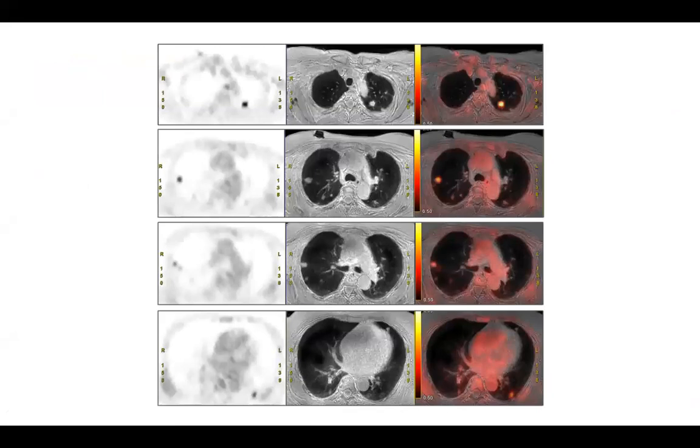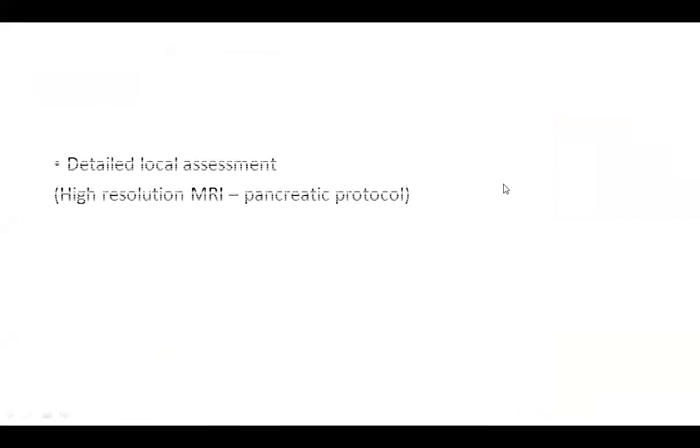Now, adding the 0TE has given us an edge in scanning the lungs, because previously MRI had certain limitations related to the assessment of the pulmonary parenchyma and the detection of small pulmonary nodules. This has been to some extent overcome by the integration of the 0TE, and it is further combined with the PET showing us the focal nodular metastatic involvement.